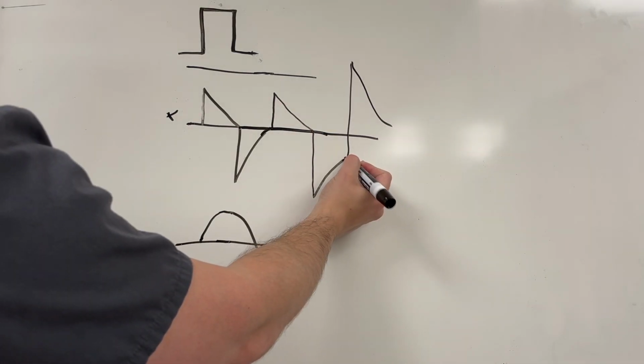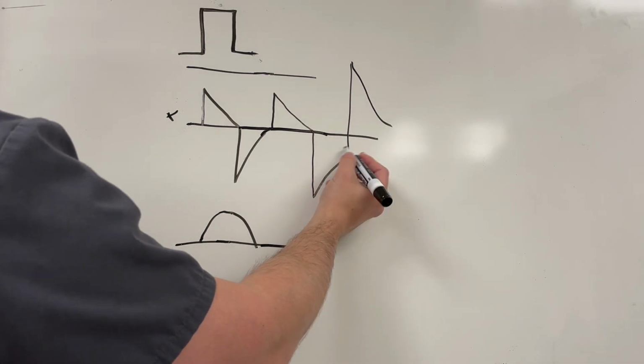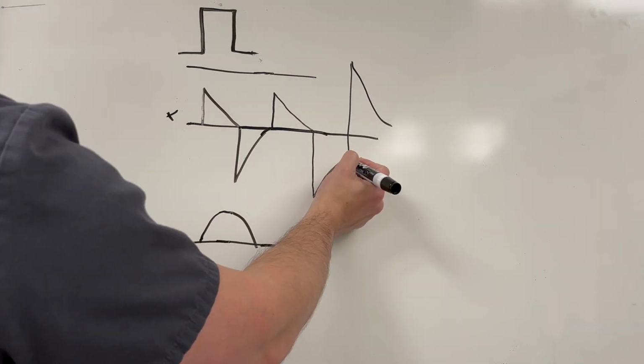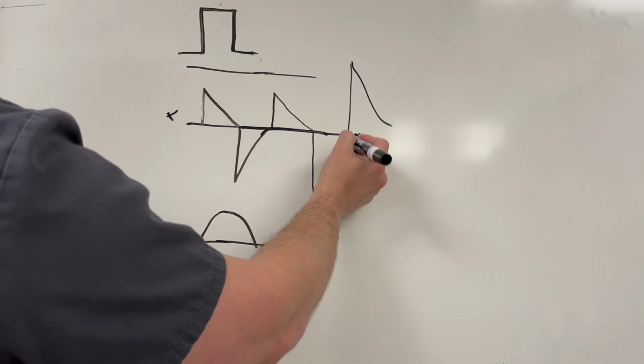When we're not reaching zero flow on this expiratory side, that means we're trapping some of this breath in here. We're not able to get out all the flow during the exhalation phase. The visual representation of that is here. The further away this is from this zero flow line, the more you're going to be trapping.